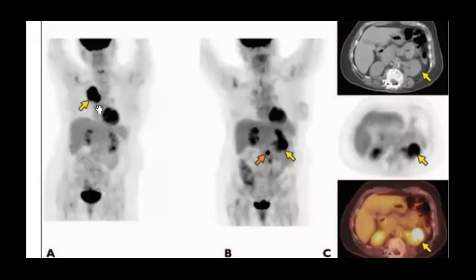So this one was the baseline, and this one was the follow-up. So what happened here, Rihan? It spread to the kidney in the follow-up. Where did it spread from? The lung. Yes, Rihan, perfect. Progression. Again, it's progression.